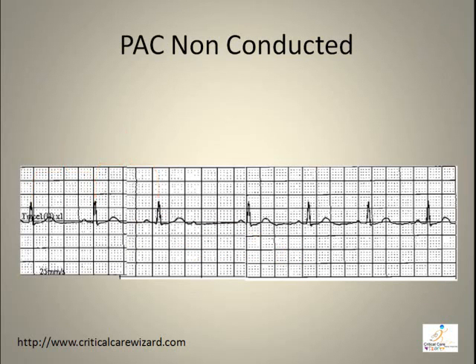Non-conducted PAC features an irregular rhythm. Non-conducted PAC is a premature atrial beat with a recognizable P wave with no ventricular response.